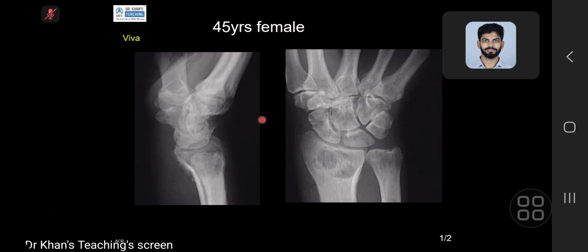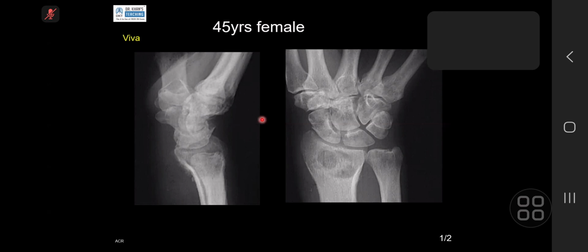There is an interrupted periosteal reaction, which is well appreciated on the lateral projection. So an aggressive bone lesion in a 45-year-old female patient, I would think of infection again, one possibility. Other possibility will be a metastatic lesion. I would inform this finding to the referring clinician and discuss the case in the orthopedic meeting. Anything else in your differential?